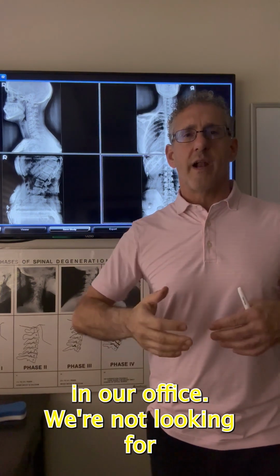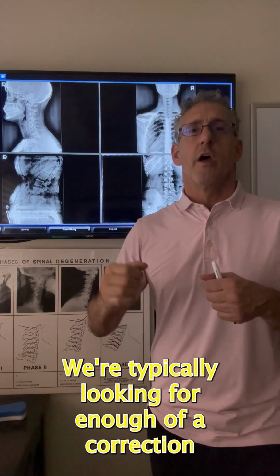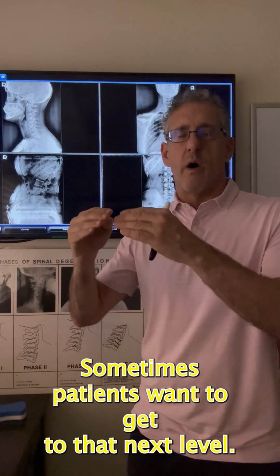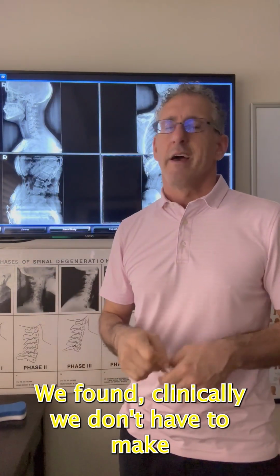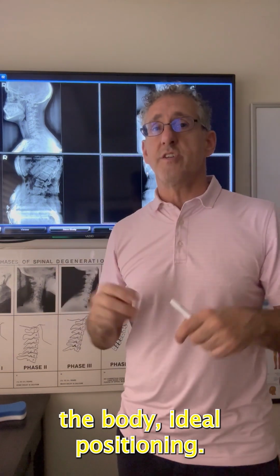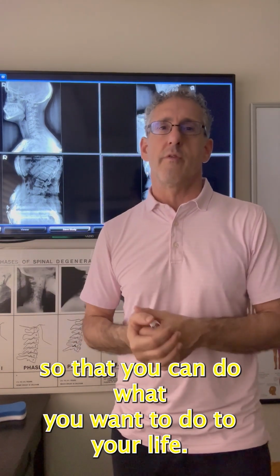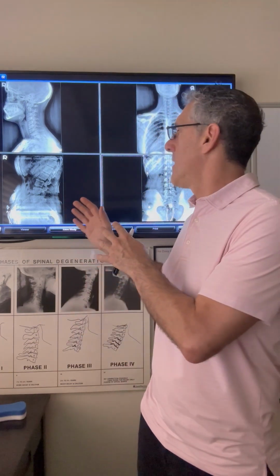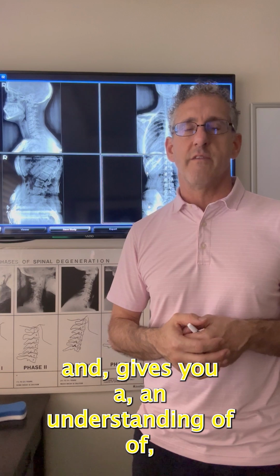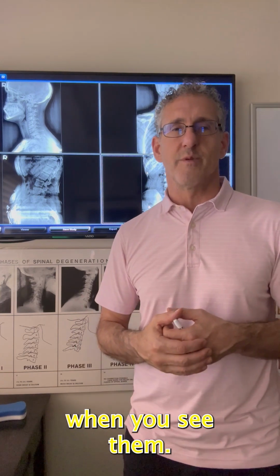In our office, we're not looking for that much of a degree of correction. We're typically looking for enough of a correction where the body's moving and functioning and you're feeling well. Sometimes patients want to get to that next level. We found clinically, we don't have to make the body ideal positioning. We just have to make it functionally enough so that you can do what you want to do through your life. I hope this gives you a good background on what we look for in our X-ray and gives you an understanding of maybe your understanding your own films when you see them.